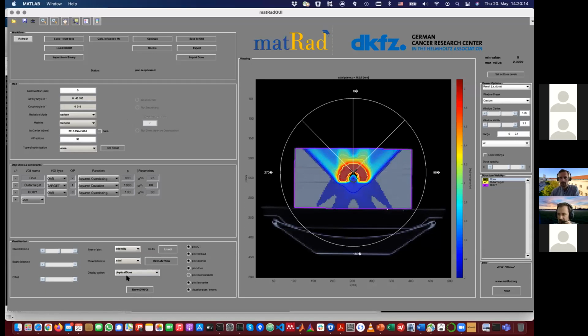Yeah, Hans-Peter, can I make a quick comment? Because I think I know what just happened, why it took so long to update to the carbon dose. Since we had a proton RBE dose in the memory, you actively need to switch to the physical dose after optimization, so it displays the carbon dose. Because the RBE weighted dose will not be computed for the carbon, so it will stick to the old dose. So you really need to click refresh and change to the physical dose.